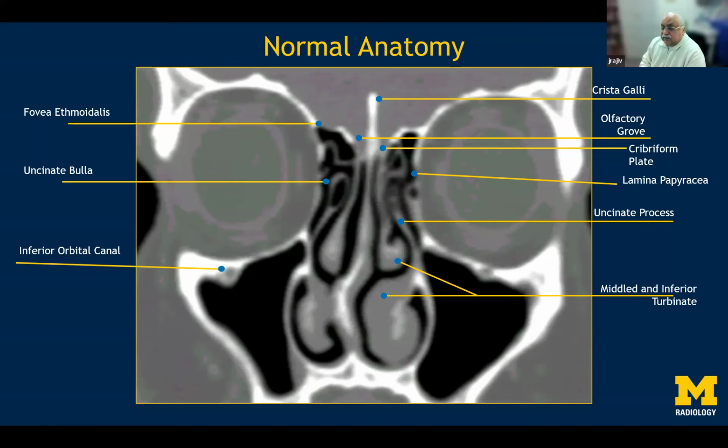It is not the direct communication between the sinus per se, which is more laterally situated in the frontal bones. Similarly, the sphenoid sinuses, we'll see a little later, have the ostia which are located in the high wall of the sphenoid sinus, which again is not mechanically suitable for drainage by way of gravity.